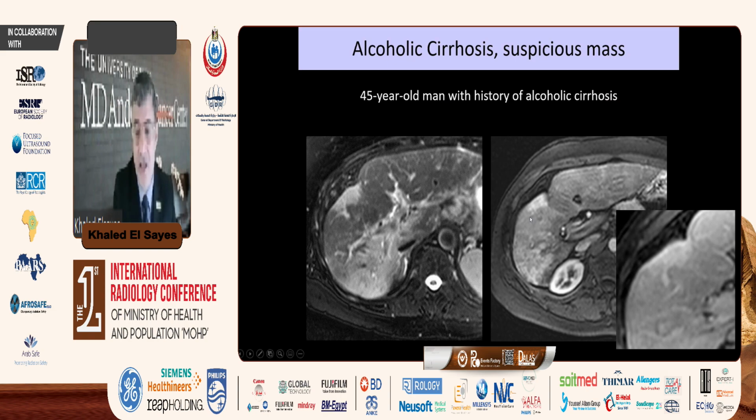It shows delayed enhancement or delayed retention of enhancement and volume loss, capsular retraction in this region. But this is actually a very common pitfall. I see it all the time. Radiologists should be familiar with this appearance. That's what's called confluent hepatic fibrosis.